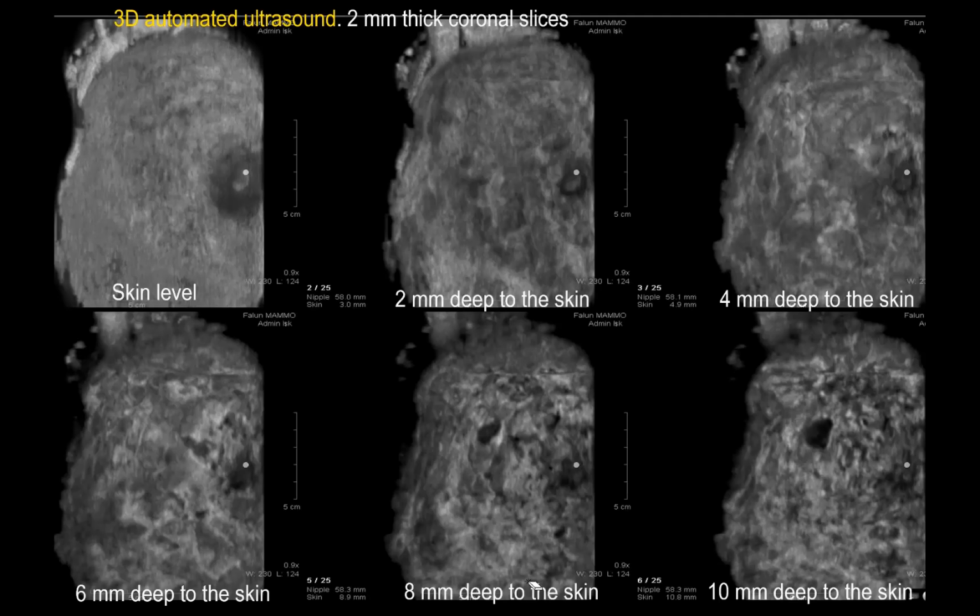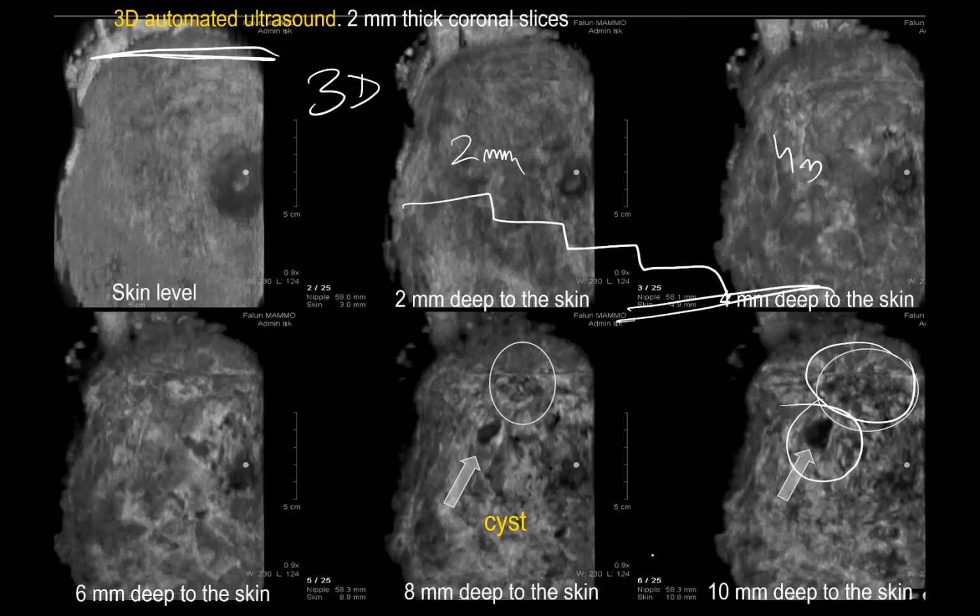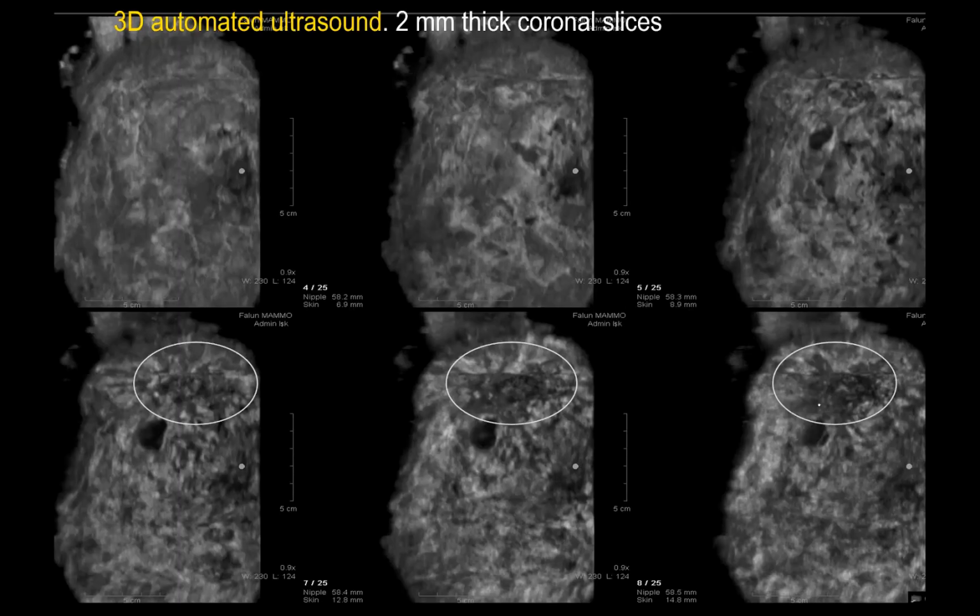That's my point. You have to use in the future 3D automated ultrasound, which shows one and another defect. There are 2 defects here. This one we are going to talk about. This is 2 millimeter deep to the skin, 4 millimeter, 2 by 2 by 2 millimeter. You go to the chest wall. So now you see at slide 6, that is 12 millimeter deep to the skin, you see 2 tissue defects.